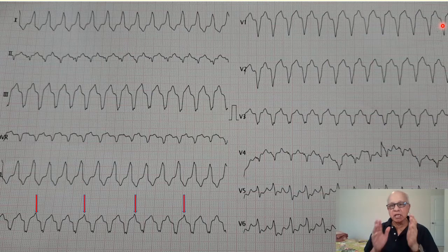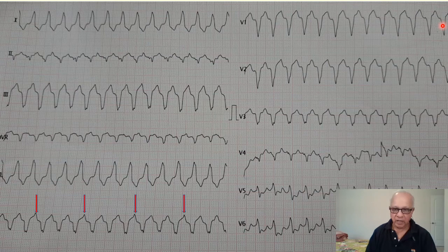But see, when you have multiple criteria, you don't have to have all the criteria in every patient to diagnose VT. Some of the criteria are enough. Fusion beat is an important criterion which is diagnostic, right? But here we don't have it. Another diagnostic criterion is occasional capture beats. Then definitely it tells you. The concordant pattern and all may be there, may not be there. Okay. But there is another very important thing. That is also a diagnostic criterion.